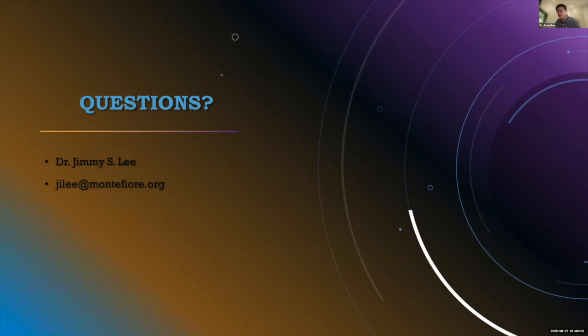But if you only have CT to start, and CT is a lot harder, then you look at whether there is something like a partially empty sella. Again, the globes, depending on technique, you can see whether or not they're flattened, or a little bit more tortuous optic nerve. Yeah. So essentially, I don't say that I made the diagnosis, because there's that criteria. So I usually tell them to correlate with physical clinical exams.